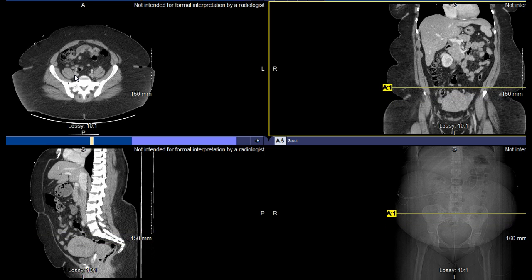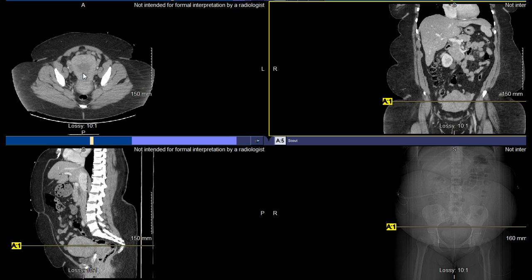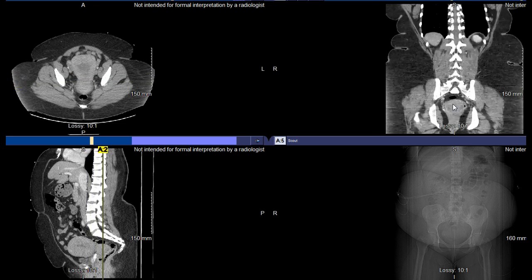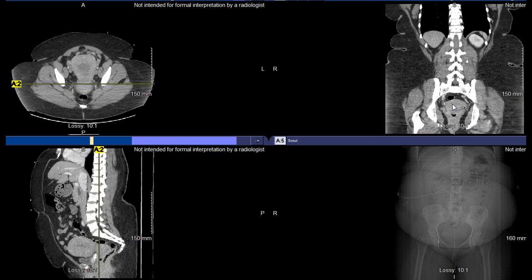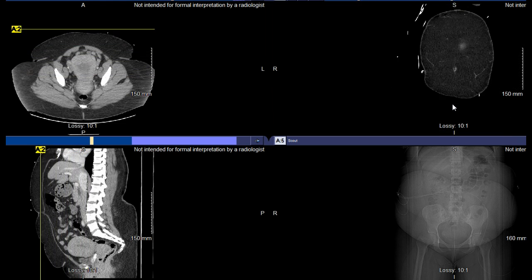Now, female anatomy tends to be a little bit more difficult, especially in the learning phases, as you're breaking things down. One thing that is problematic or more difficult to visualize is the ovaries. So I'm going to utilize a different imaging plane to help us determine where the ovaries are. The plane that I'm going to utilize and focus on is the coronal orientation. So basically, let's go from anterior to posterior. Here's that anterior side for this particular individual.